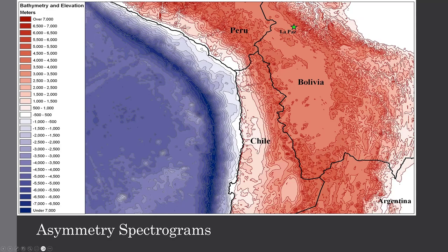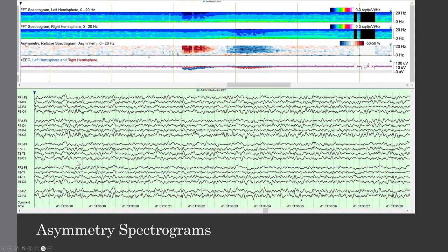So let's go ahead and apply this to EEG, because I think we get the idea. Here we're showing EEG traces below, and we're showing some trends above that. This is just something that we'll do when we're showing EEG in relationship to trends as part of this webinar. But as you can see, we begin to squish the EEG vertically, and we begin to compress the trends vertically as we add more trends. That's traditionally done back when there were very few trends used, or even with a neonatal EEG when you just had a couple of channels of amplitude integrated EEG and not that many channels of waveforms. It becomes difficult when we start looking at full 10-20 recordings and an array of trends. Everything gets kind of squished vertically.